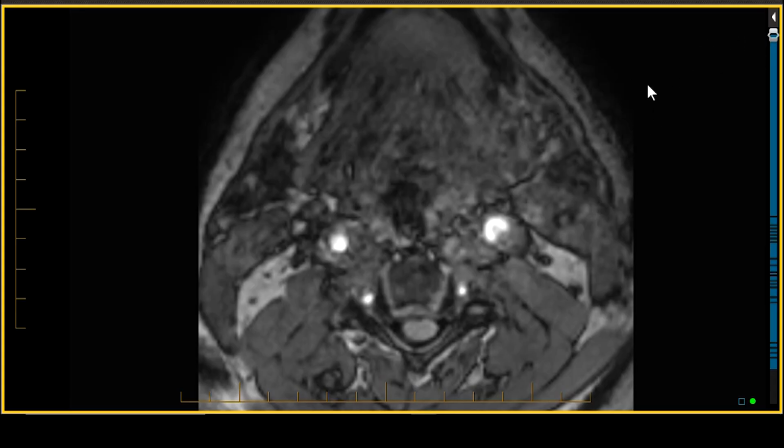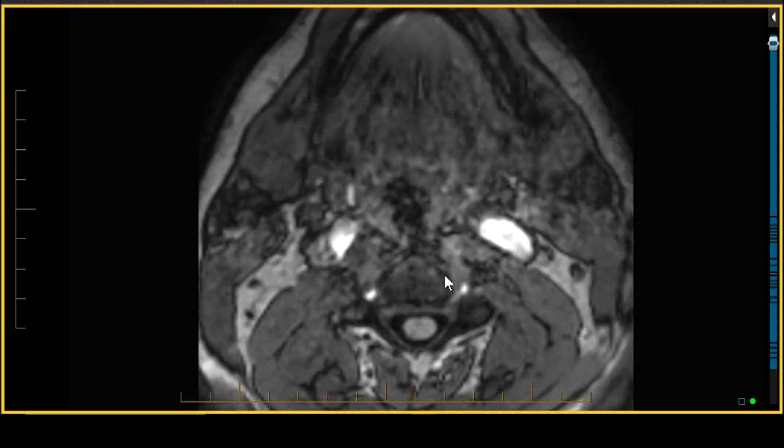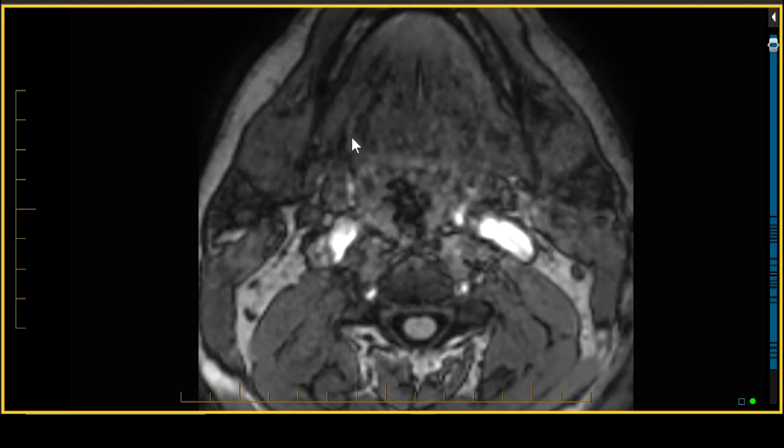Let's start with the SMG first. We're just atop the region of the submandibular gland. It's pretty hard to see on this T1 weighted image, but let's scroll a little bit. And we see this ill-defined sort of stellate round structure that lies just lateral to the hyoglossus, or right near or on top of the hyoglossus, but along the posterior margin of the mylohyoid.